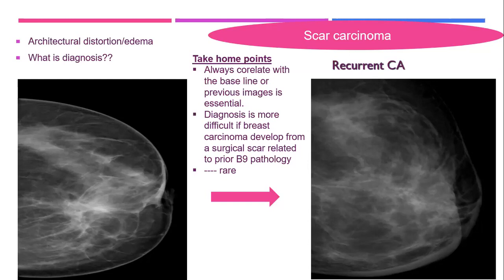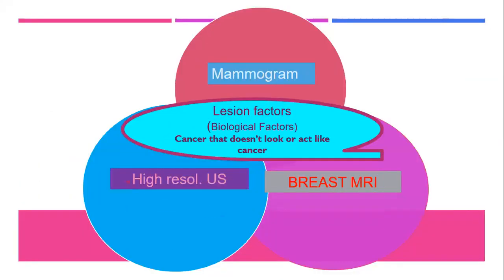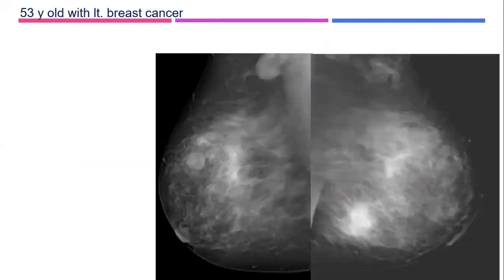We have to look if there is any fullness, or if the calcification moves aside or becomes more fragmented than previously. If you have dystrophic calcification getting fragmented or moving in its place, or the scar showing some fullness, then you have to consider that you have a mass arising at that area. Okay. So we went through the lesion factors, and let us see the observer factors.